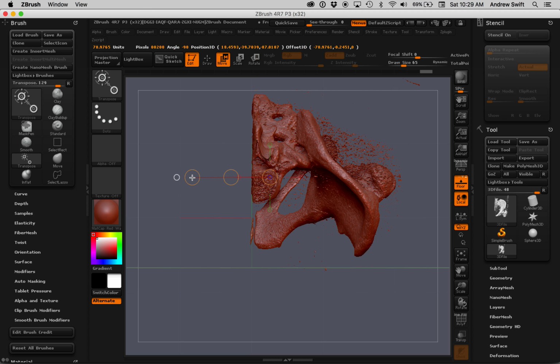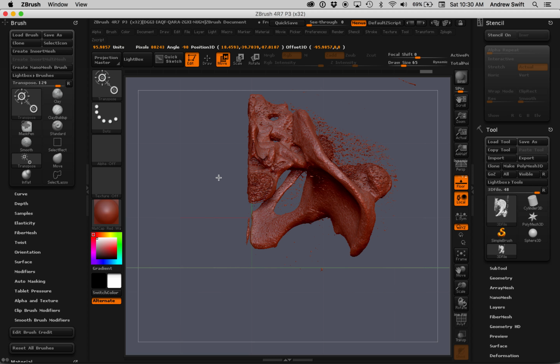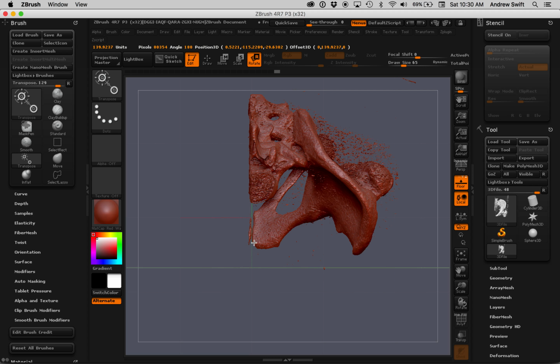So I'm going to click and drag with the Move tool, M for Move, grab this middle button, hold down Shift, and drag it like this, left and right. And I want to rotate it a little bit more. So this spinous process right here is what we want. But now, this is going to be the midline where I am right now, and I don't really want it right there. I want this pubic symphysis just a little bit off.